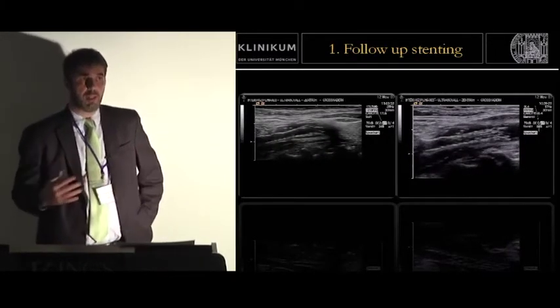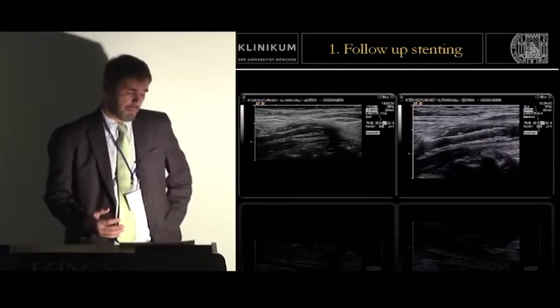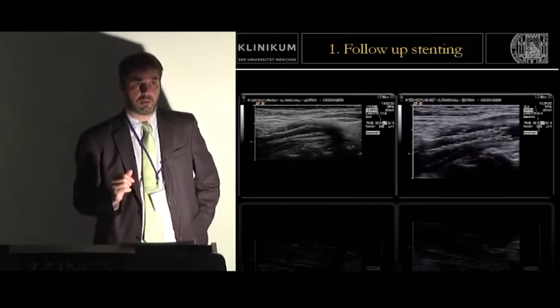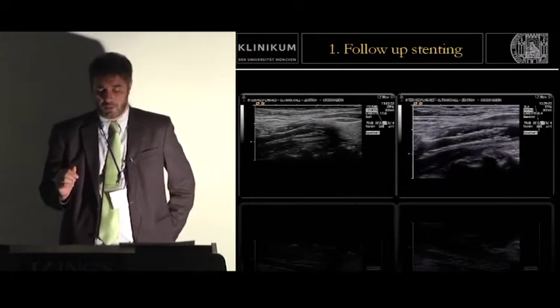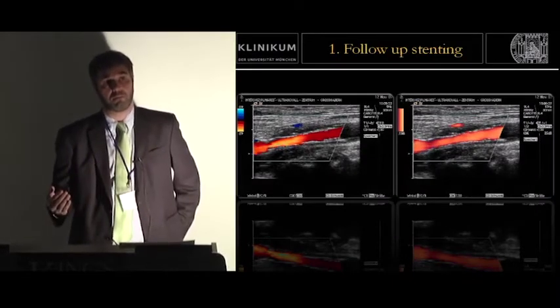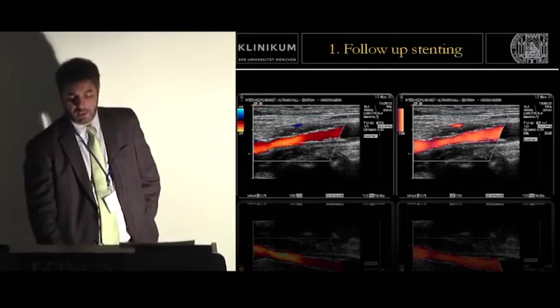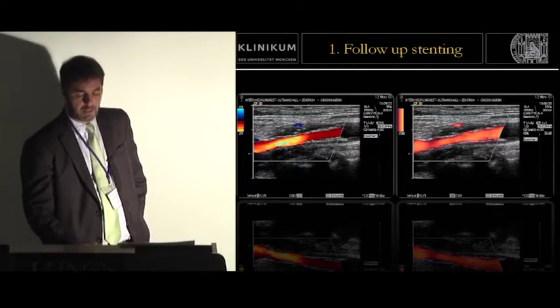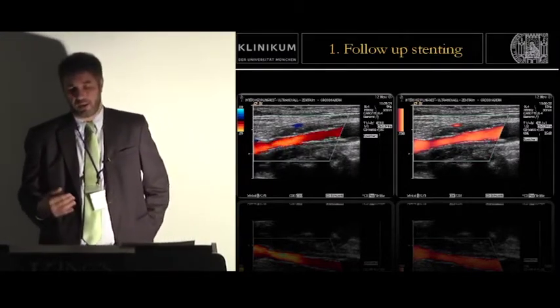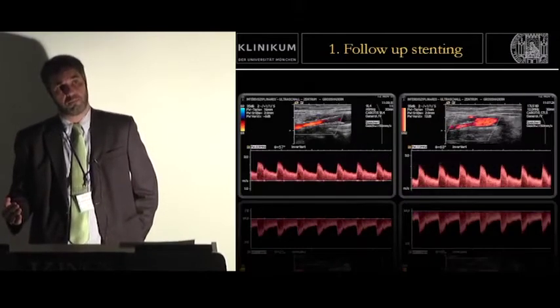If you think about stenting, you also have to keep in mind that sometimes patients suffer from in-stent stenosis. So if you look carefully at the stent graft and I ask you, do you see any stenosis? You will probably say you need the Doppler. I give you the Doppler and power Doppler. And you ask yourself again, do you see stenosis?